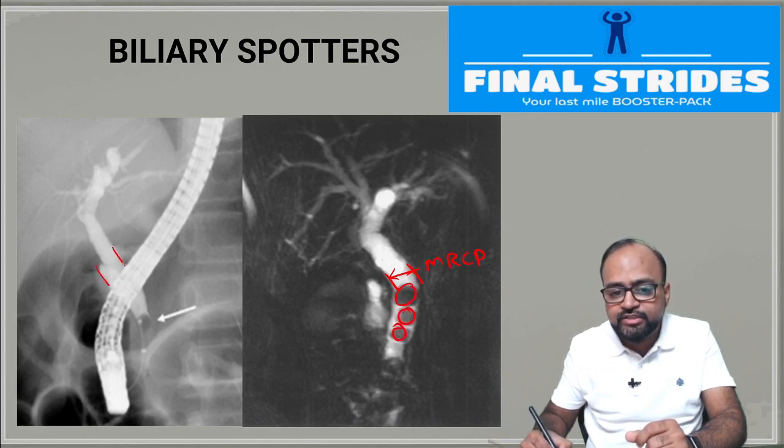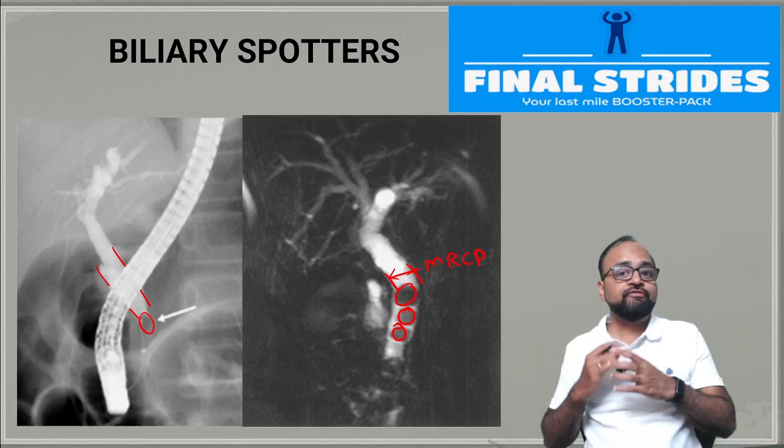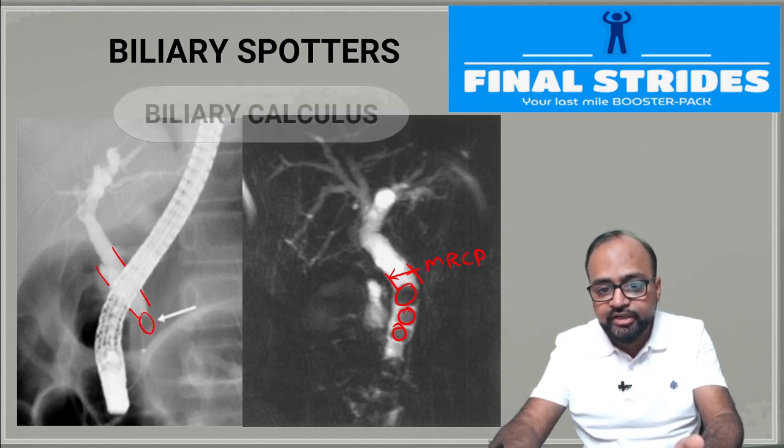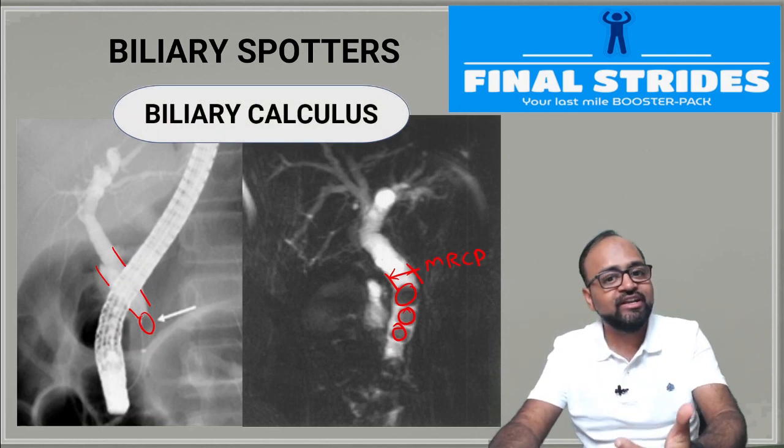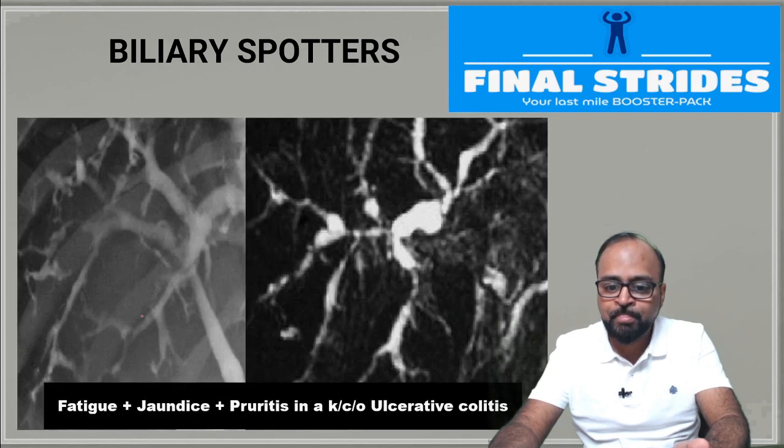Look at this dilated CBD on ERCP. Can you see this filling defect within it? If you see filling defects within the biliary tree, this is how biliary calculi are going to appear. They are the cause of dilatation of the biliary tree here, right?